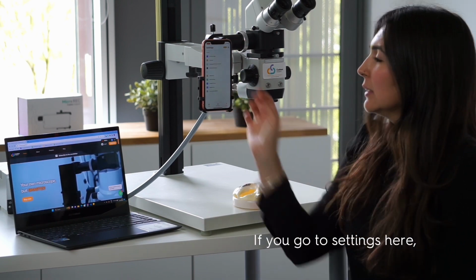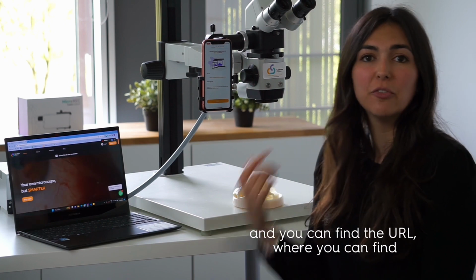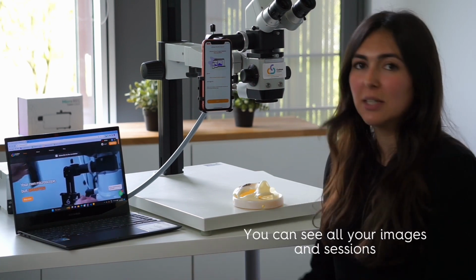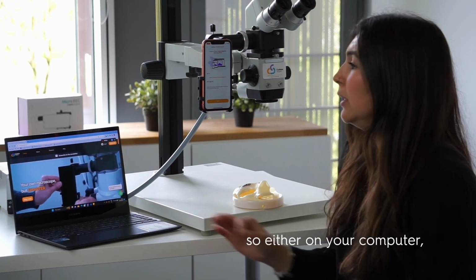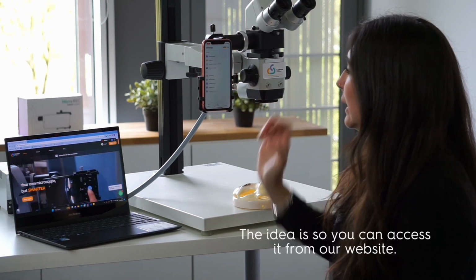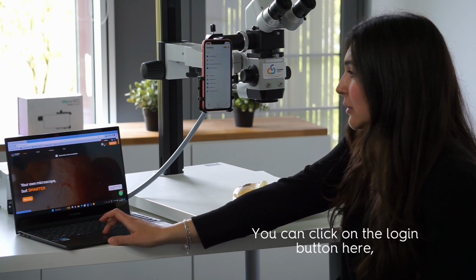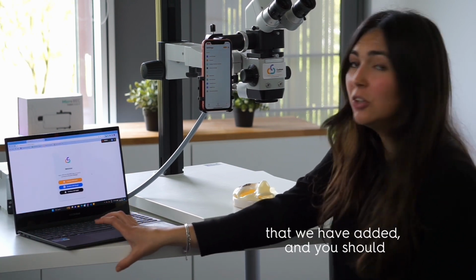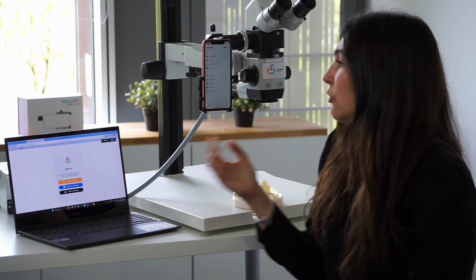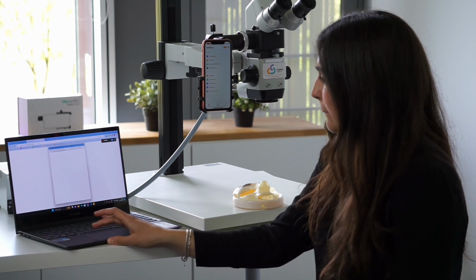If you go to settings here, you can click on Web App, MicroREC Connect, and you can find the URL where you can find the web application that we have developed. So you can see all your images and sessions on any device that you want, either on your computer, on your tablet, or on other phones. You can also access it from our website. You can click on the login button here that we have added, and you should log in using the same account you have using your MicroREC app. For me, it was the Apple ID, so that's the same one I'm going to be using here.